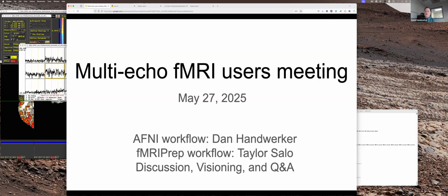One of the big requests we've had was a run through of the pipelines and how people actually use the program. So what I'm going to do is a demo run through of the script I would use to run tedana with AFNI, and I'll verbally narrate myself looking at the results to give people a sense of that. Then Taylor will do the same, and we can have questions as we go or at the end of these two. So here we go.